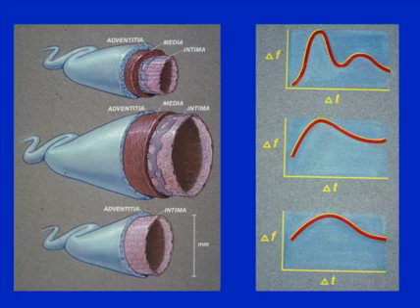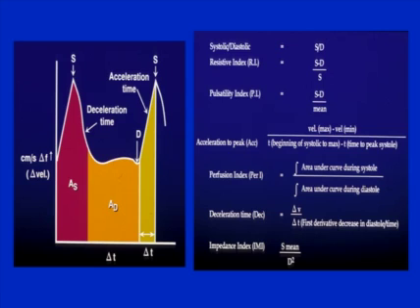Now, it was theorized that if we look at the various vessels, the one on the bottom is a tumor vessel that lacks a muscular media, that there is increased diastolic flow in these tumor vessels as compared to the vessel on the top, which has a muscular media which constricts blood flow, and the differences in the waveform are significant. Now, the vessel in the middle is a vasodilated normal vessel, which can have a very similar appearance to either normal or neoplastic vessels.